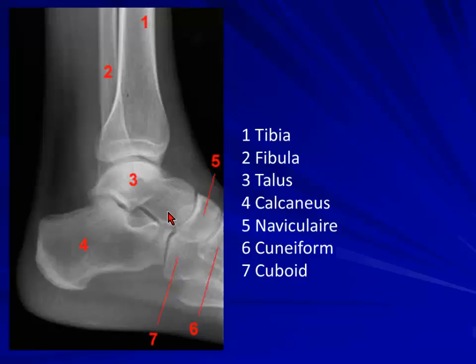The anatomy is very important for the feet, if you are doing SPECT CT, and you need to know the exact anatomy so that you can localize the abnormality. You see these projections here. You've got two projections posteriorly over the talus. One is the medial, towards the medial side.